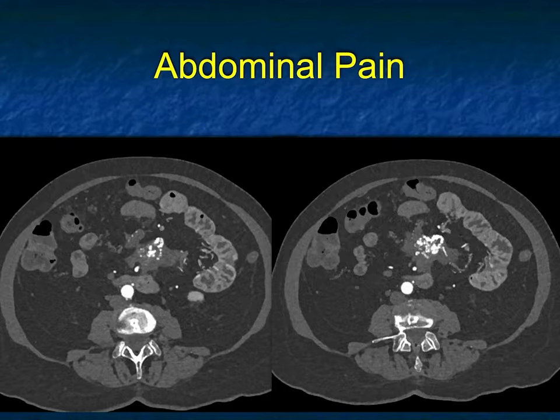Now, if you had more images, you want to look at the vessels. Encasement of the SMA is more common, as well as SMV with carcinoid tumor. Also, perhaps you may see an additional finding like a mass in the terminal ileum that's vascular, which is the primary carcinoid tumor. If you only see the mass in the mesentery and you don't see much of a desmoplastic reaction, you're probably going to push yourself to sclerosing mesenteritis, particularly when it's an incidental finding, as was for the most part the case here.